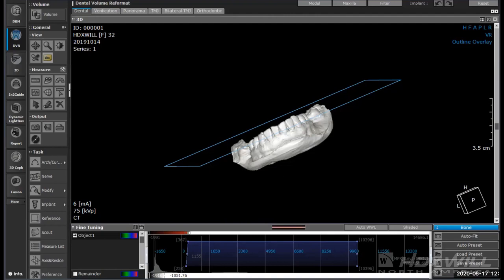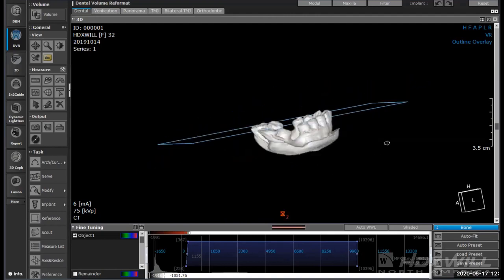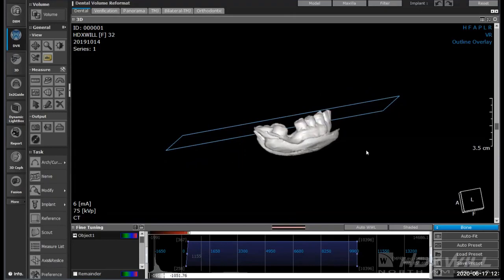So at this point, we've gone through implant planning. We've gone through looking at the different implants that we can use, assessing our bone, and assessing where the implants are going to be. Now we can integrate an STL into our image and make sure that we can overlap it, so we can put in our implant planning where we know where the soft tissue is. We talked about abutments, and we've also talked about ways in which we can obtain an STL along the way. With that in mind, we're about 40 minutes in.